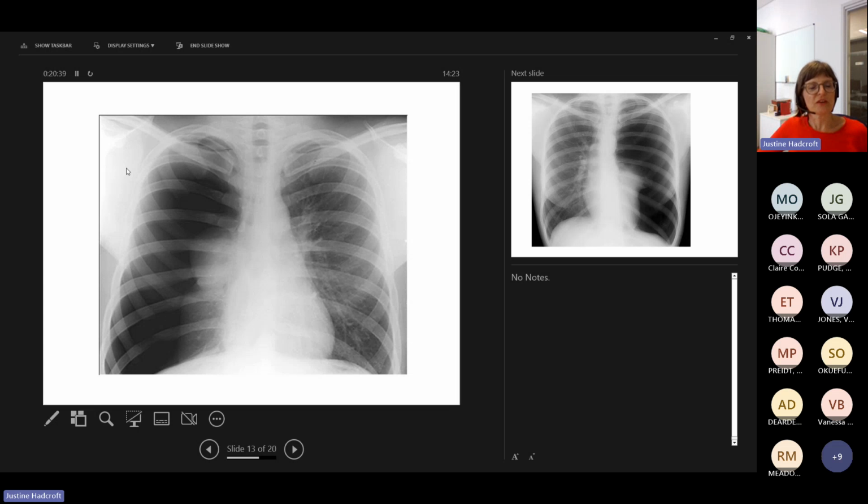And when we're looking at pneumothoraces, we talk about tension pneumothorax. If your pneumothorax is big enough and there's still air leaking into the pleural space, eventually the air starts to push the mediastinum and the heart over into the other hemithorax. The way we look for a tension pneumothorax with mediastinal shift is to look at the tracheal position. Clinically we'd be examining for tracheal position, and if the trachea had been pushed to that left side, we'd be very worried about a tension pneumothorax and probably want to decompress it before we did a chest X-ray. But if the trachea is central, you do a chest X-ray first, and the trachea is central.